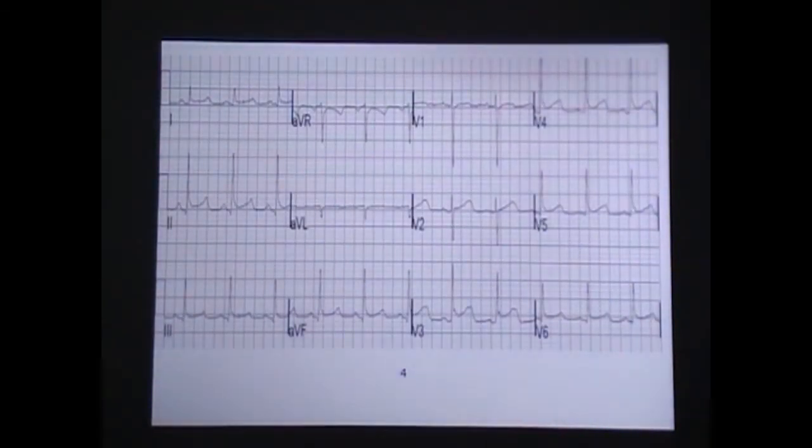All right. What jumps out at you guys on this one? So I heard someone say ST elevation in 1. Okay. Where else? I would say finding the J point on here, because the way this swings down, I probably put the J point right there. Isoelectric line, so I've got some there. Do I have anything in 3? It's slight. It perks my interest. So if I know I've got there, I'm automatically going to go 2, 3 in aVF, and both of these have a little bit of something going on, right?